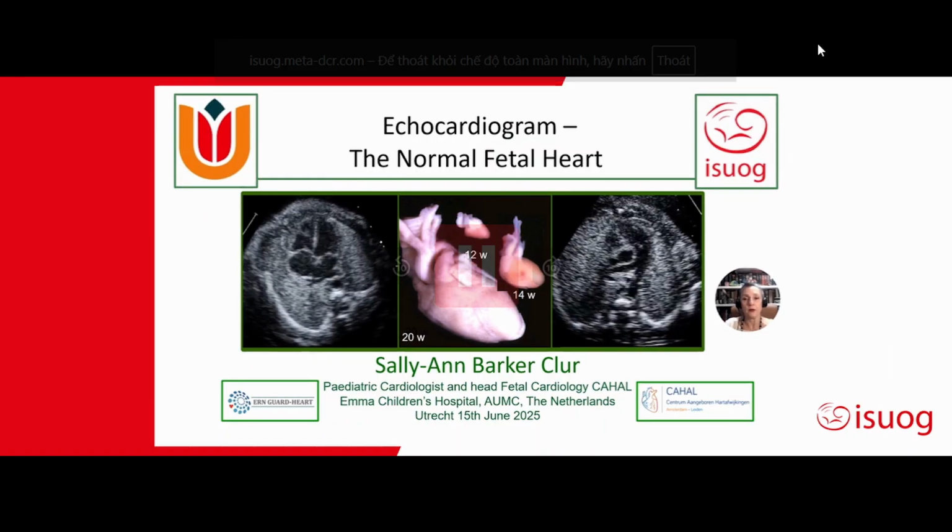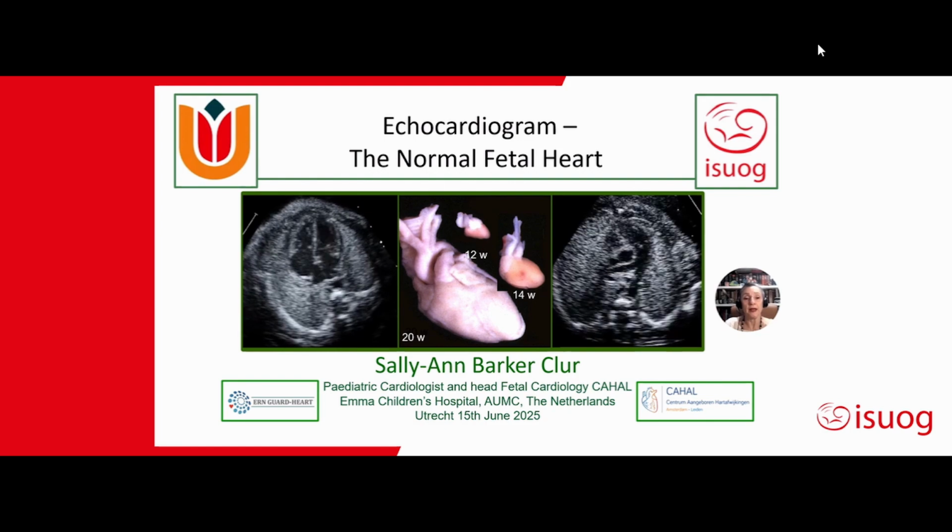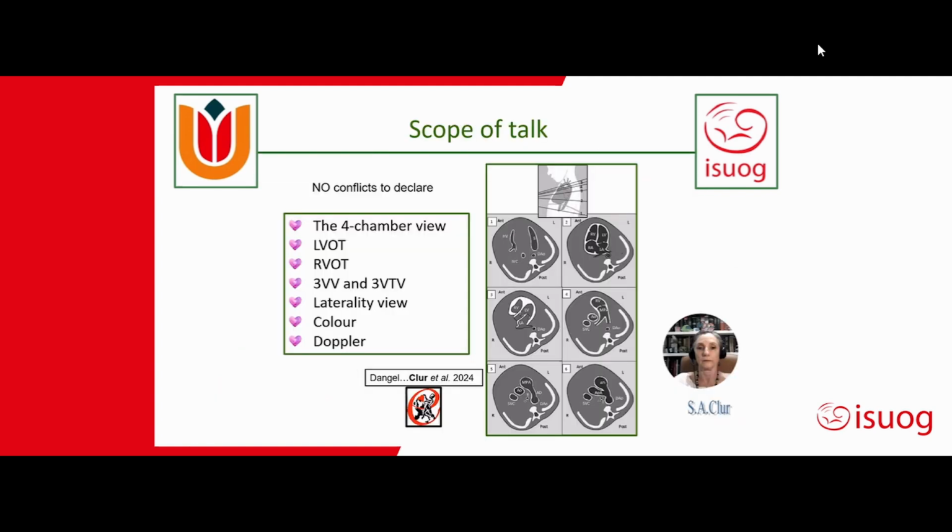Unfortunately, a live scan will not be possible, so I will replace my live scan with a talk about the normal fetal heart as seen on echocardiography. I will focus on the standard views used in screening, the laterality view, and tell you something about color and pulse wave Doppler.